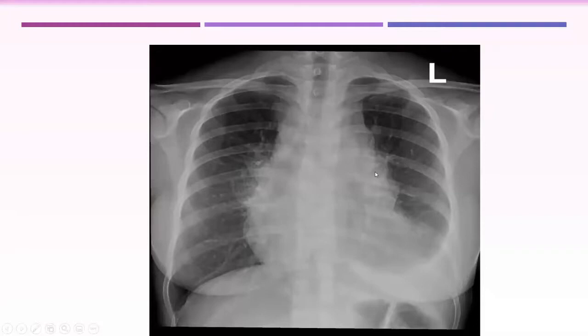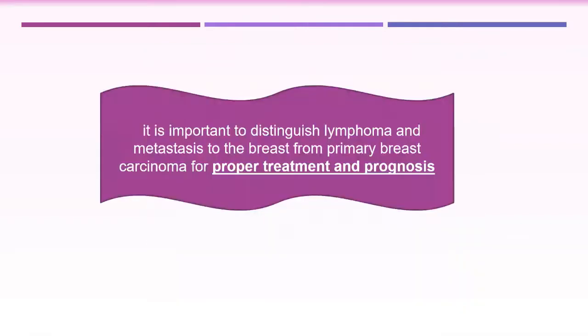Look for lymphangitis, reticulonodular opacity radiating from the hilar regions and from the thickened pericardium, and the left pleural effusion demonstrating pleural thickening and enhancement in a case of lymphoma. That was our case of lymphoma.